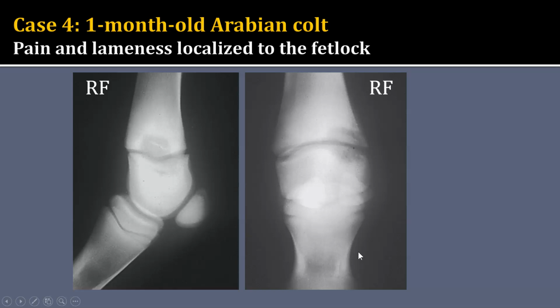It is centered and collimated, but I also notice that this is not the greatest exposure for both bones and soft tissues. And just for an aside, the reason is that these are actually film-based radiographs that were digitized, and so we're going to lose some of that latitude. They're not as lovely as our digital images that we obtain in most practices these days.